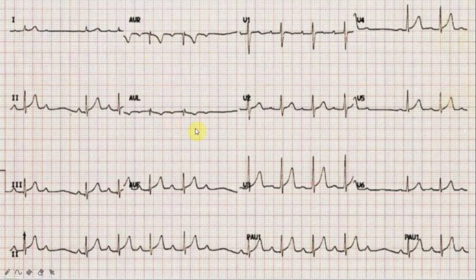Now to compile all this information together, I am of the impression that the patient has a Mobitz type 1 second-degree AV block. I am a little concerned about this patient. My immediate action would be to seek and treat the underlying cause. For example, the patient may need further workup from a myocardial ischemia point of view.